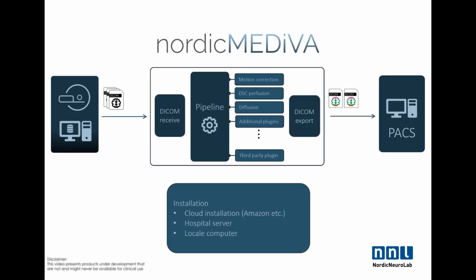NordicMediva can be installed in the cloud, at the hospital server, or on a local computer. The administration of the server is done through something we call NordicMediva Dashboard. This is a web-based tool where the user has full access to all configuration of the system and analysis settings.